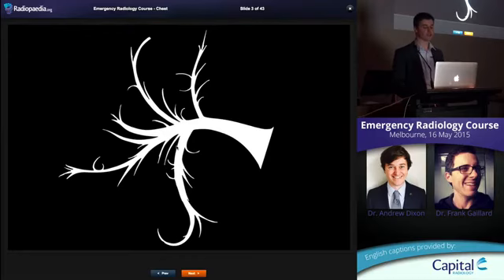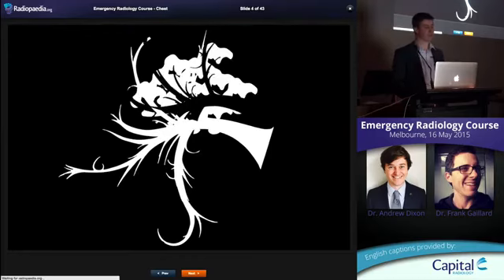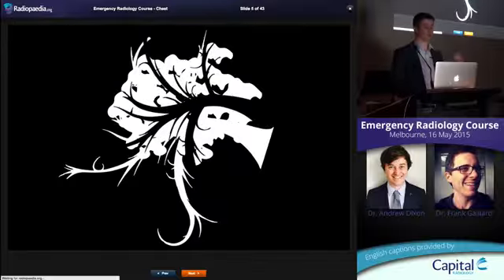Okay? As soon as you start to see airspace opacity arising, so the alveolar space is filling up with pus or fluid or hemorrhage or proteinaceous material, anything, you can't really tell the difference between them. Once it starts filling up, you'll lose the ability to trace the vessels through there, because the fluid or the pus is a similar density to the vessels, and you'll start to gain the ability to see the airways moving through there, so bronchograms. And the more you have, the more obvious that becomes, okay?